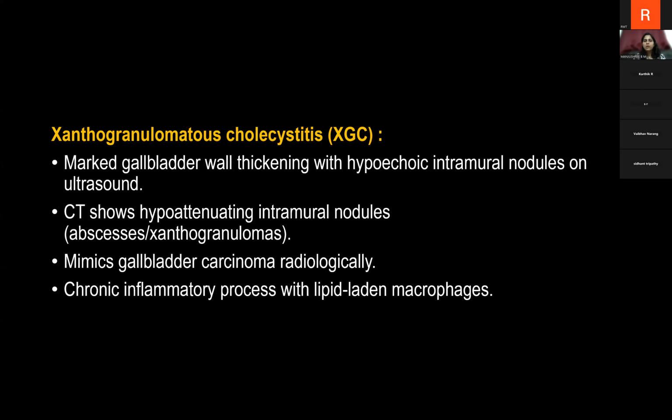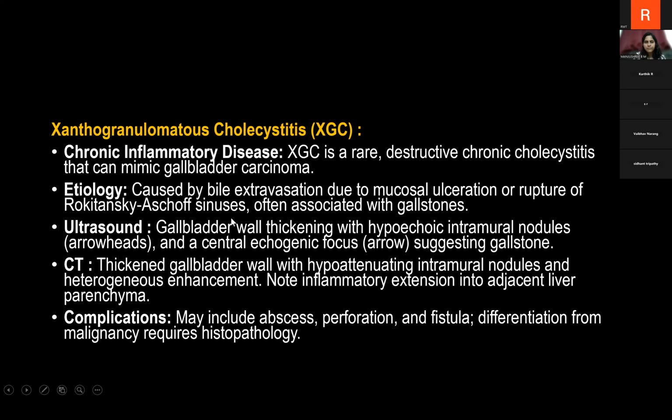So there's marked gallbladder wall thickening with intramural nodules, as I showed you. It mimics gallbladder carcinoma radiologically. This is basically due to chronic inflammatory process with lipid-laden macrophages. Okay, let's go to the next spotter now.